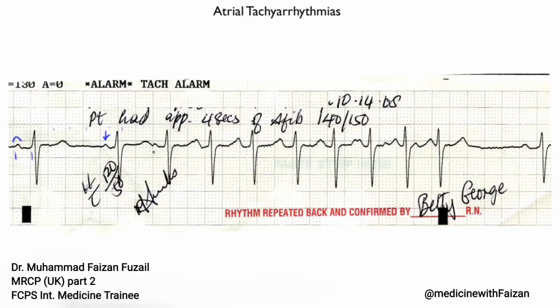You would expect the next beat to occur in here someplace. But you can see that there is a P wave here that starts off something rather fast. The first beat occurs somewhere above 100 beats per minute, but you can see that there's a slow increase in heart rate by the end of this, just over 150 beats per minute, maybe 155. You can characterize this as having a gradual increase in heart rate. It's a rapid heartbeat, so it's a tachycardia. You see P waves that start the tachycardia, and the QRS complex looks exactly the same as the underlying QRS complex. So what would appear to be coming from above the ventricles?